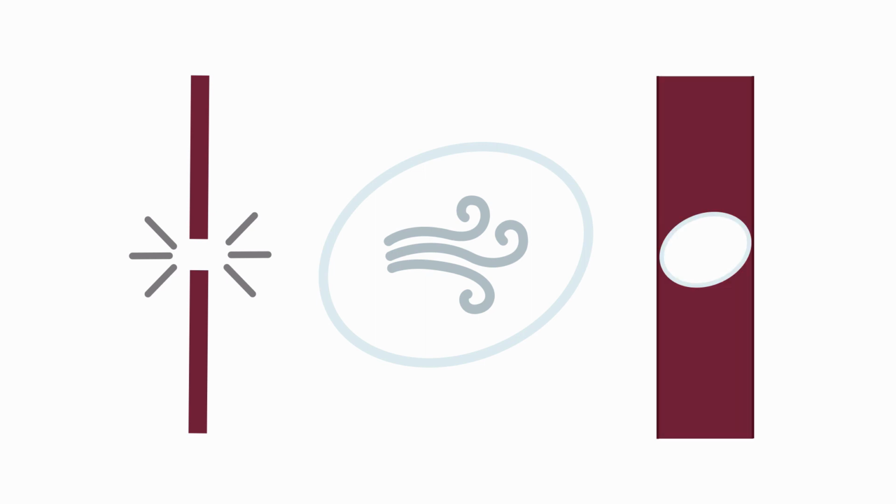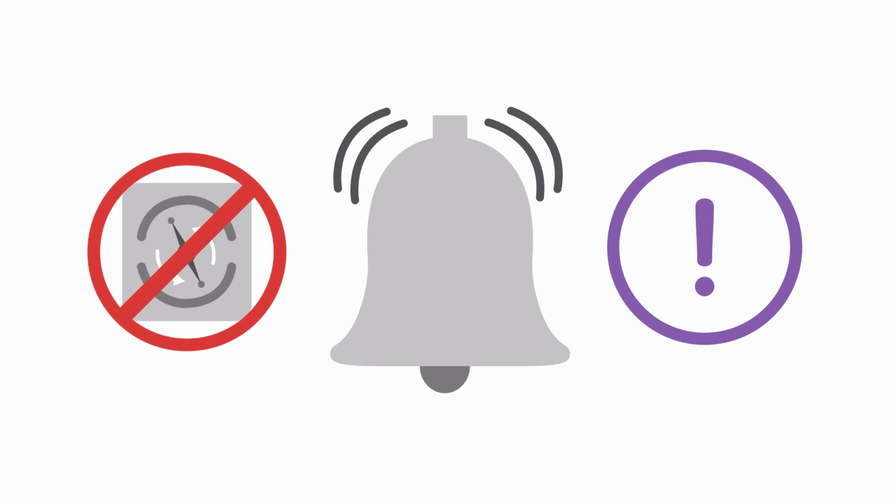Bubbles of air can be trapped in the fibers of the dialyzer, leading to reduced dialysis efficiency and clotting of the circuit. If enough air gets into the circuit undetected, it can even enter the bloodstream, causing an air embolism. Usually the pressure monitor is configured to stop the blood pump if there is a disconnection and loss of negative pressure that exceeds the set limits. Typically, there will be alarms and visual warnings if this occurs.